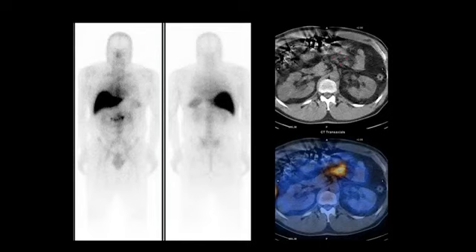Hi, this is Piyush Bhargava, and I have a few interesting cases to share with you. This video is the second part of SPECT CT applications in nuclear medicine.